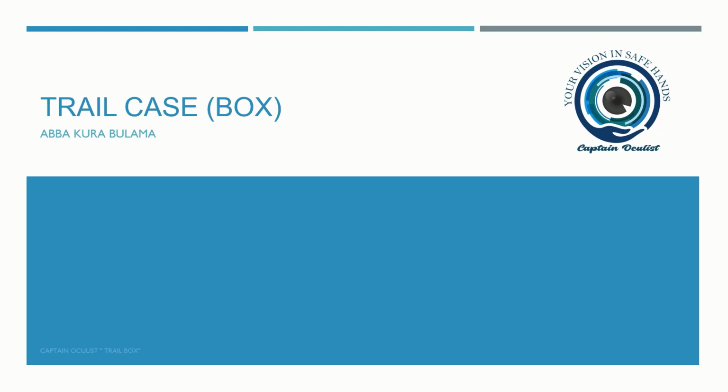Hi guys, welcome to our next session, and today we are going to discuss the trial case. In this video we shall discuss the trial case and a little about ophthalmic procedures and uses of the lenses.